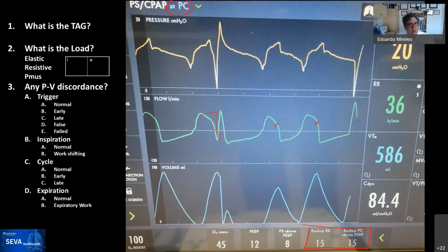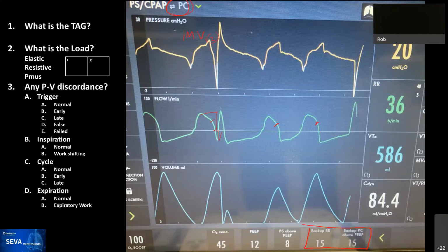The backup rate activated, and contrary to many of the ventilators we use, whenever you go into apnea ventilation, the ventilator stays in the apnea settings until somebody comes and presses the alarm button and says, shut up, and you get them back to pressure support. But that did not happen here. It alarmed, but as the patient started breathing again, startled by the alarm, the ventilator shut down the backup and went back to pressure support, effectively turning into IMV.